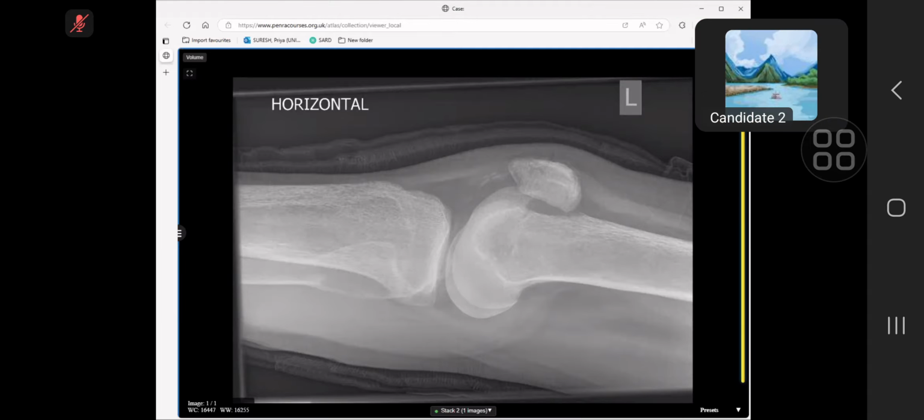Okay, so on the lateral radiograph, I can appreciate again there is an expansile lesion. There is a subtle bone break, but I am not confident about it. This lateral is a horizontal shoot-through radiograph. There is pre-patellar soft tissue thickening. There are adjacent calcific densities seen in the knee joint, in Hoffa's fat pad. The tibial and femoral sides of the bone are quite degenerative.